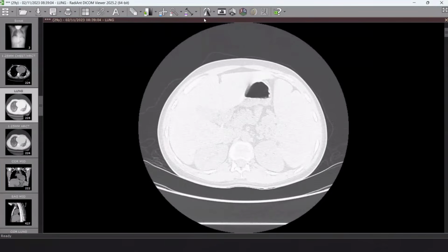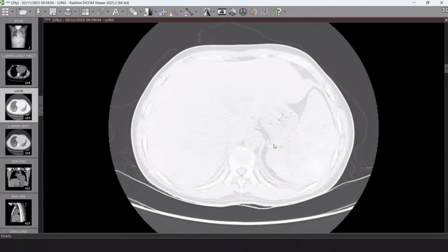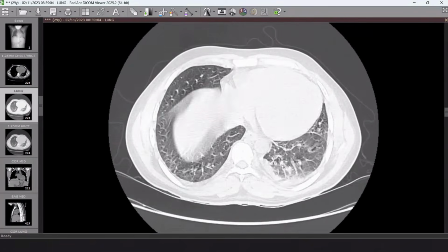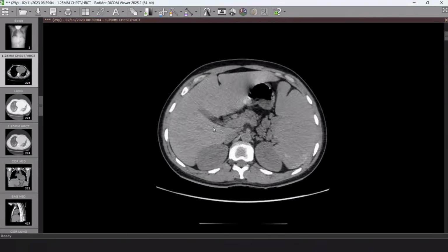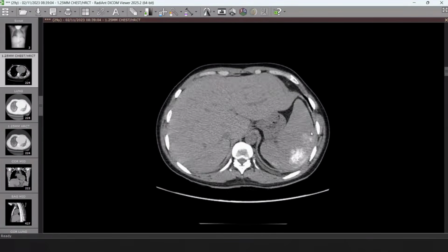By the way, we did the CT for the patient. This CT is 2 days before the chest X-ray, and the consolidative changes start to appear. Look for the spleen, the splenic infarcts with calcifications.